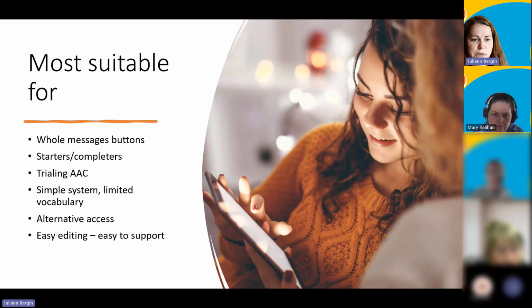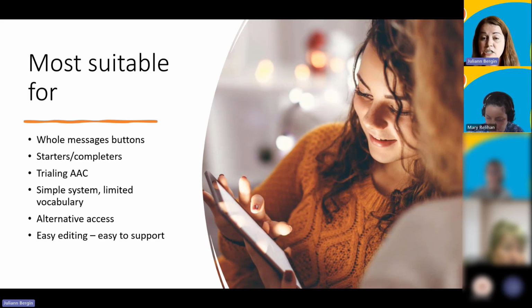So just to sum up how we can use this, as I say, it's using recorded speech. So as such, it does not have a keyboard page. So you cannot use it for somebody who's literate, for example. This would not be an appropriate system for somebody who's got literacy skills. It's a really nice one for somebody starting out with communication or has a limited range of things they need to communicate about. You can use it for whole message buttons, so replicating what you might do with a Big Mac or a Little Mac communication device, those single message devices where you press it and it says something. So we'll talk about that.